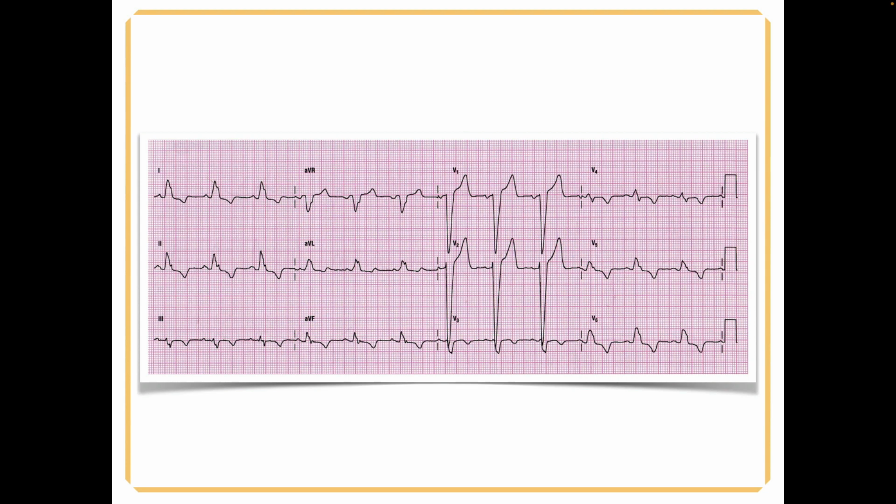So let's go through here, and Natalie, if you wouldn't mind, if you just go through and look at lead 1, tell us, is it mostly positive, mostly negative, or neither, and go through all the leads. 1 is positive, 2 is mostly positive, 3 is mostly negative. Uh-huh.